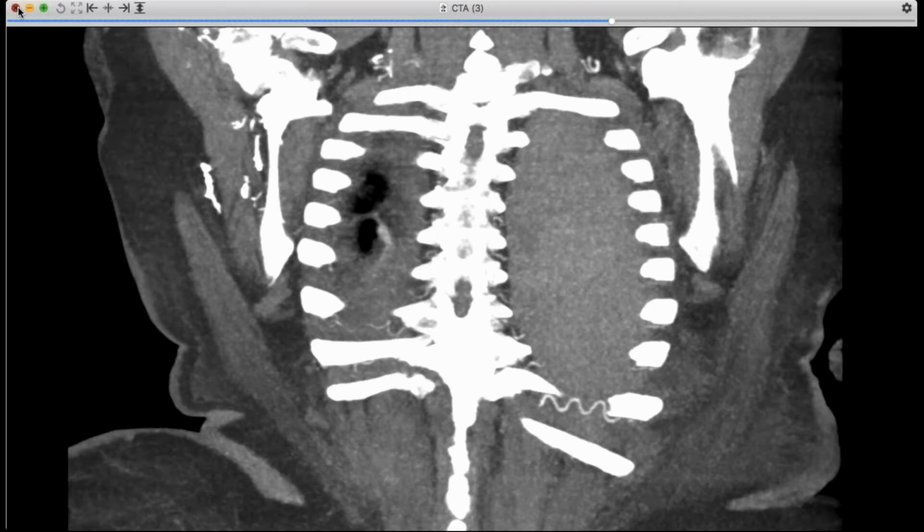And the team noticed the patient wasn't doing well and wisely chose to re-image the chest, thinking maybe there was a pneumothorax, but in this case, actually a hemothorax. But for the junior people watching, a rapidly developing pleural effusion is typically blood and not just serous fluid from heart failure. It takes a little bit more time for that.